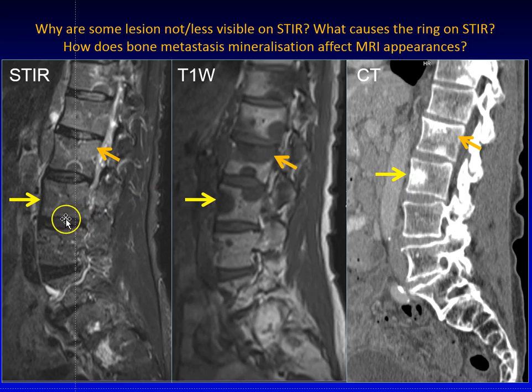And if you look around the edge of this lesion, we can see there's a very faint halo. That halo effect is, I think, shown much better at the bottom here, where we can see this lesion has quite a thick halo, but very even. That corresponds to this metastasis, which of course you should now recognize as an area of sclerosis.